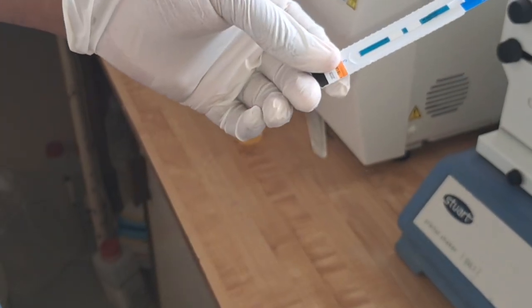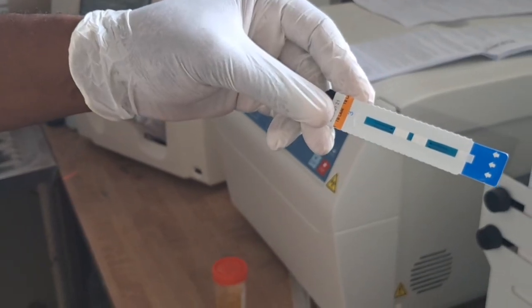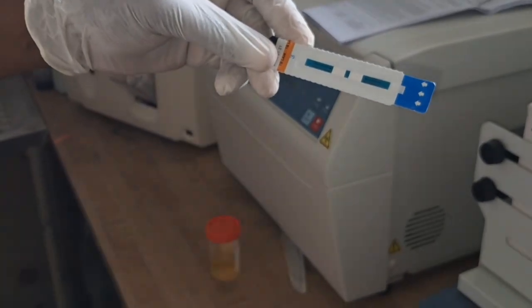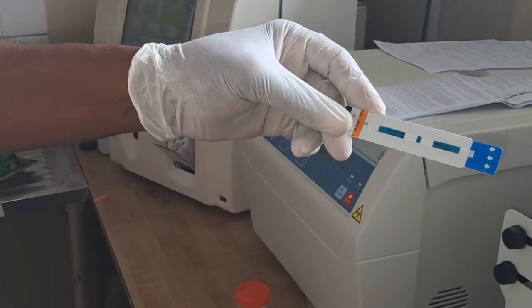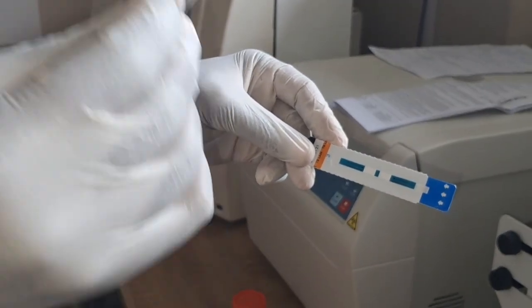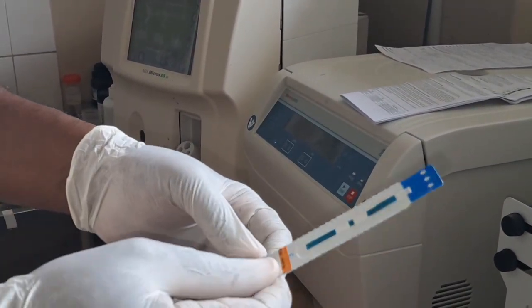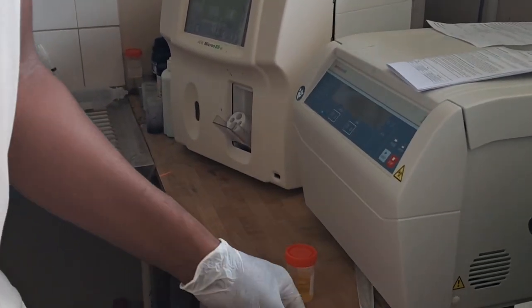So this is our RDT LAM. Once you remove this, you have to do the test within 2 hours. After removing this, within 2 hours, you do the test. If it is more than 2 hours, then this one is no longer viable. You can't use it anymore. You discard and get another one.